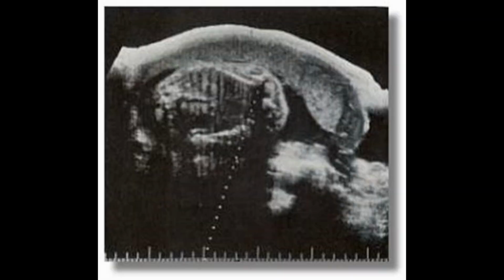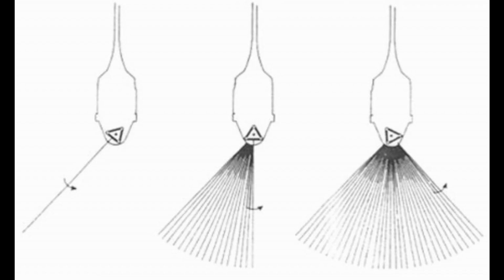The transducer is that little white cylinder at the end of the articulated arm. To change frequency, you simply unscrewed the transducer and screwed on another one. Here are some images I took as a student in the late 70s. Notice the images are black on white. In the early 80s, they switched back to white on black. In the late 70s, real-time was introduced.